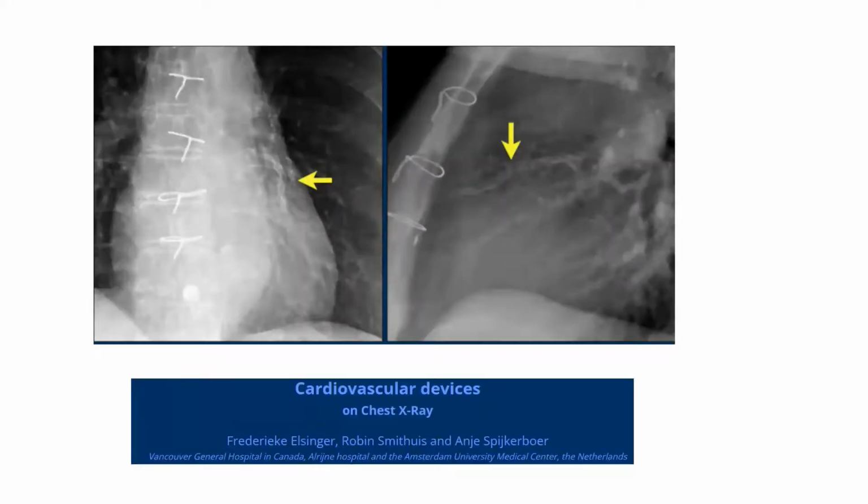Okay, another guess. What are you seeing here? What are we seeing here?